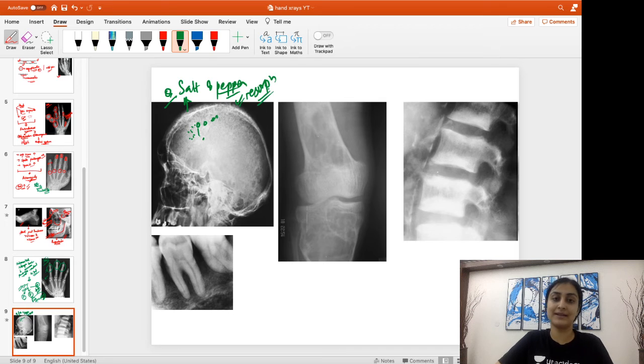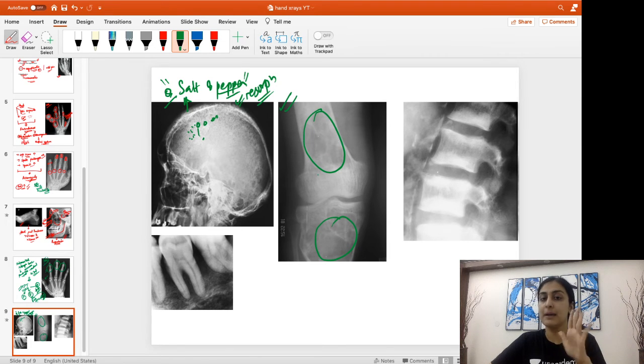So what is the action of parathyroid, right? Again, if your concepts are clear, imaging findings are just an expansion of that. So parathyroid hormone basically will eat up the bone, right? It will release the calcium and phosphate from the bone, because of which you have these tiny foci of bone resorption. This is given the name salt and pepper appearance. Again, very important. In the bones, guys, what we have are these multiple lytic lesions. So remember, there are multiple lesions, again like enchondromas, but typically tend to affect the long bones. Okay, so multiple lytic lesions which are called the brown tumors. Alright, so these brown tumors are also associated with hyperparathyroidism.